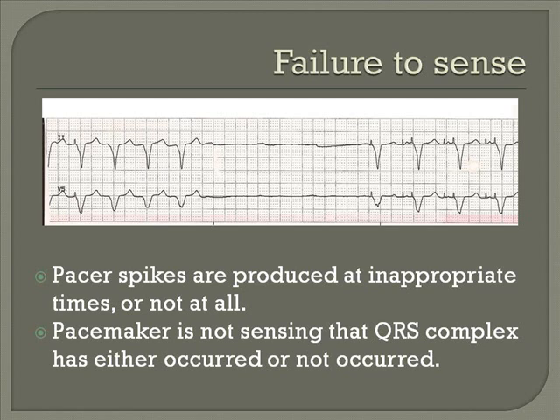You'll probably also notice that after the pacemaker restarted, it's doing an AV sequential, as there are 2 pacer spikes for each beat. This is usually a sign of a damaged internal computer of some sort, and the only treatment for it is replacing the pacemaker.